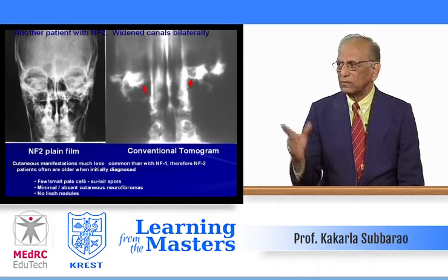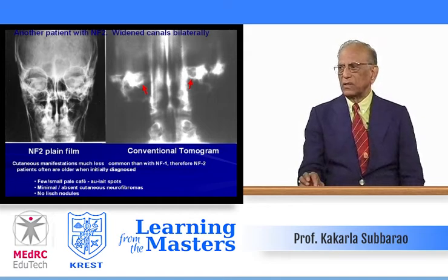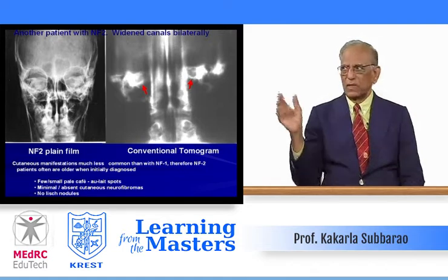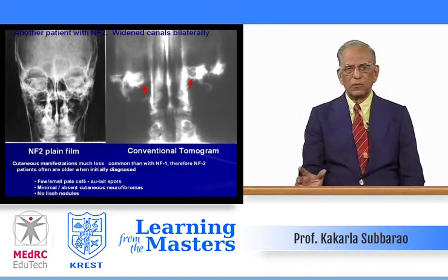NF2 plain film. On your left side shows the acoustic canal widening. Conventional tomogram taken earlier. At that time we didn't know it was NF2, but now we can categorize it retrospectively.